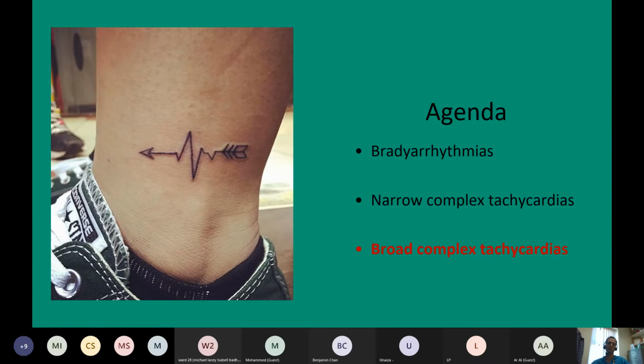that a VT. What about if you knew the patient had a history of some sort of cardiomyopathy? So you don't know exactly what, but they've got a cardiac history. So what would you say, does that increase the chances or does that decrease the chances? Do you think it's more likely this is a VT or less likely this is a VT if they've got a prior cardiac history? So the fact they've maybe had an infarct in the past, or they've got dilated cardiomyopathy, maybe they've got left bundle branch block as a baseline because of that. Do you think it means it's less likely they've had a VT or more likely?